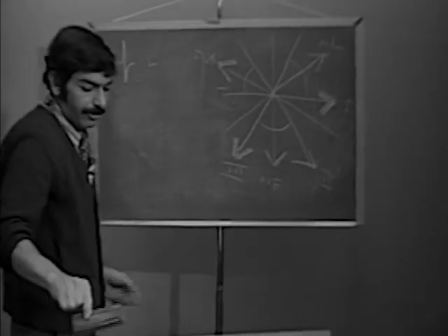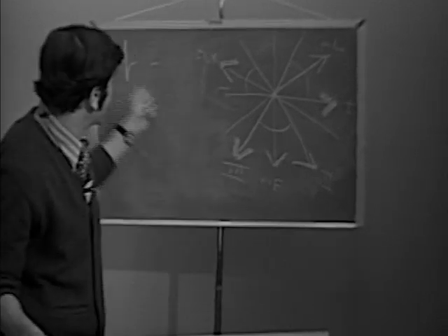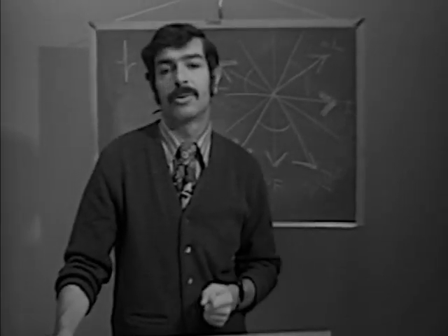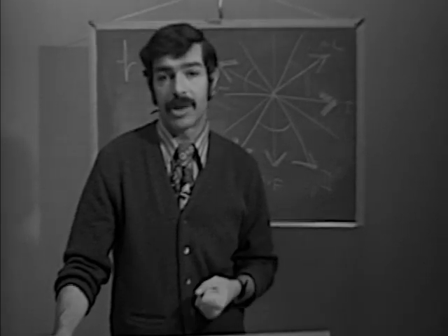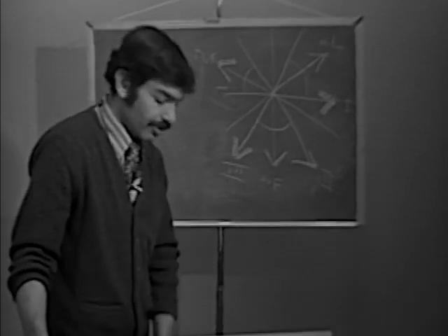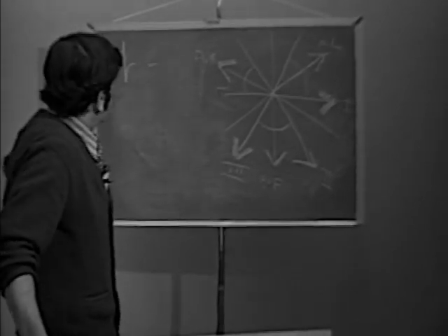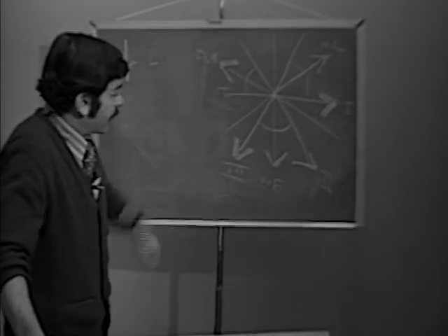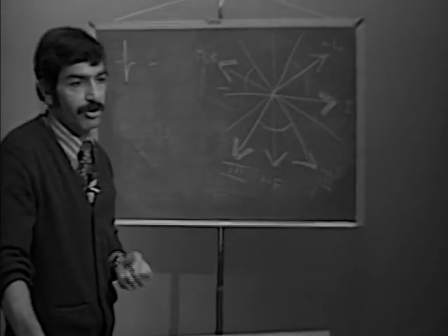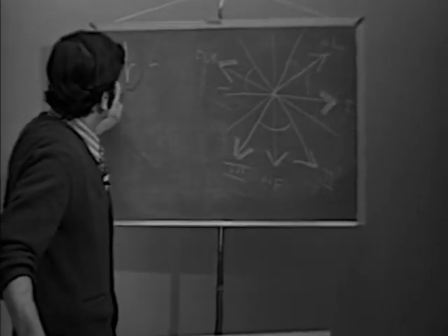Okay, those are relatively rare, and there are diagnostic implications when you see things like this. Certain types of infarctions will look like this. Patients with chronic lung disease will occasionally have indeterminate axes. Okay, but going back to this situation, as I said, most every electrocardiogram will have a lead which is most nearly isoelectric. So we look for this lead.